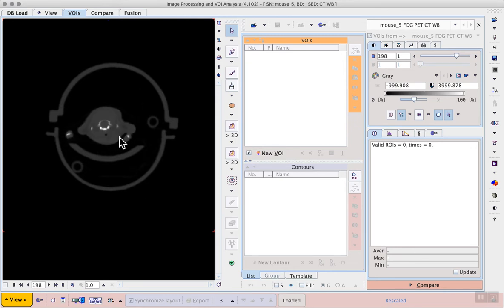And now if we were to scroll with the mouse button or the touchpad, we can still explore the animal and work out what we need to include for rendering. I want to be particularly careful to keep this forelimb. So we know that the abdomen will be larger than the head, but we can clearly see where the bed is and the cell and this tubing.